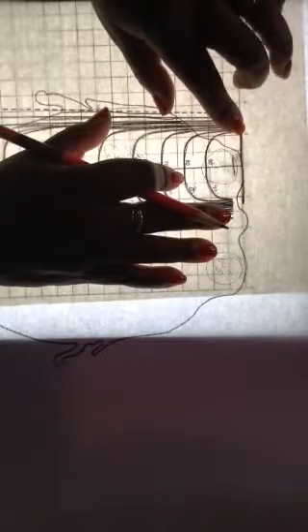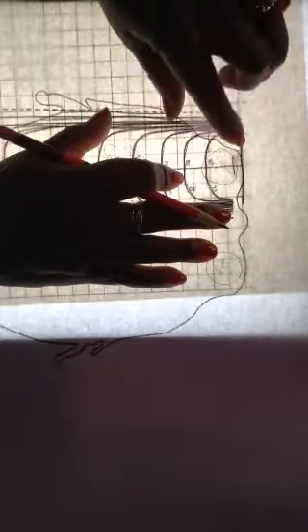I can number these, 1, 2, 3. Actually, take your centimeter ruler. I don't have a centimeter ruler here with me. I actually have my sewing tape, but I'm going to measure this segment, that segment, and that segment. You could even create a sub-segment if you wanted to. Maybe I could create a segment between these two segments. Just make sure you draw a straight line. It'd be nice if you had a ruler.